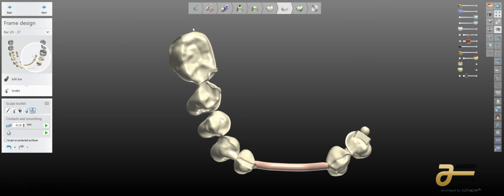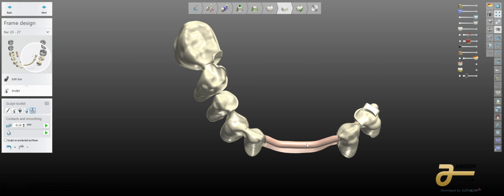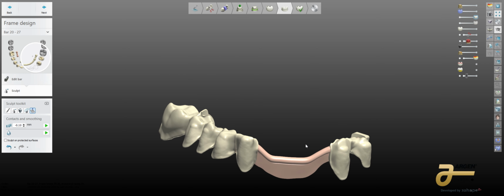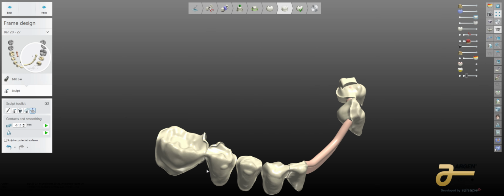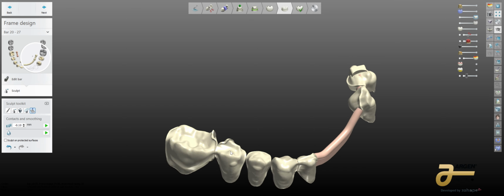So it allows longevity. If you really think about this design and what we've accomplished here, we're trying very quickly to aid these teeth in lasting as long as possible. Making a rigid connector here, double abutting here, is spanning the load across this in a manner that is going to be beneficial to the long-term success of these teeth. Double abutting on this side, very similar. We're managing the load of this appliance.